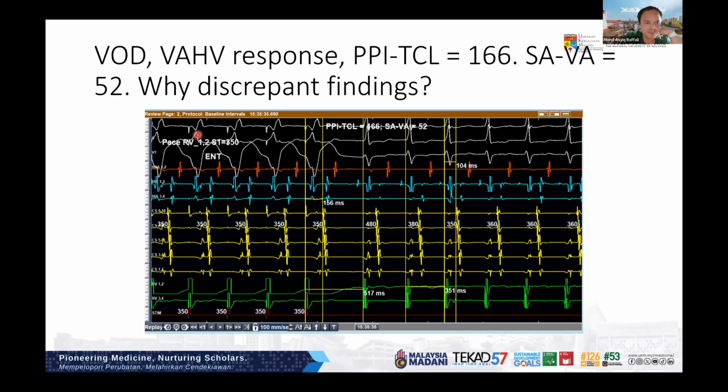If it was apical, it would be unlikely. So it would be septal-ish. The septal, I think. Yeah. That is also shown by the fact that your RV catheter on the bottom, I assume the green color, is that correct? Yes. That is earlier than your other V, so I think it's septum pacing.